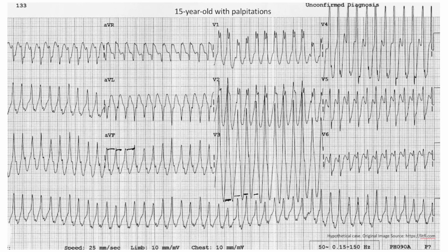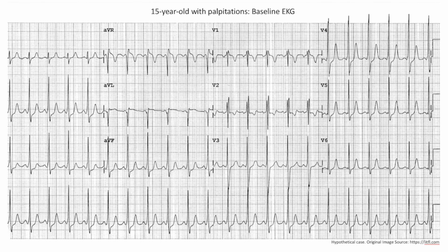Now, if you've known this person for a while, let's say the person had a prior EKG that looks like so. When you look closely, notice how there's an initial slurring of the QRS complex in multiple leads, and this would be the delta wave. So you have the delta wave. And also notice how the duration of the PR is lower. So this person actually has WPW syndrome.